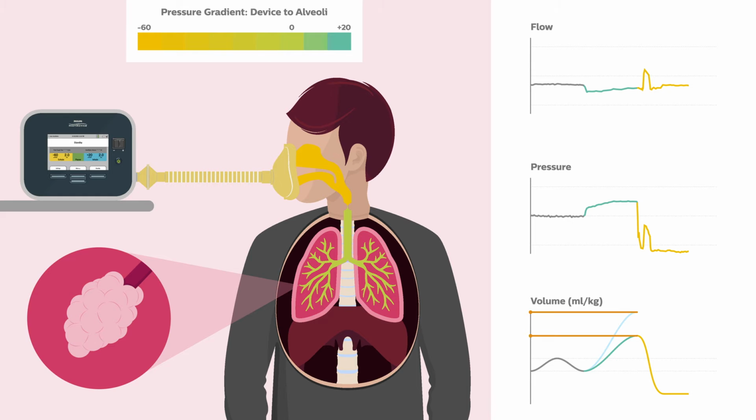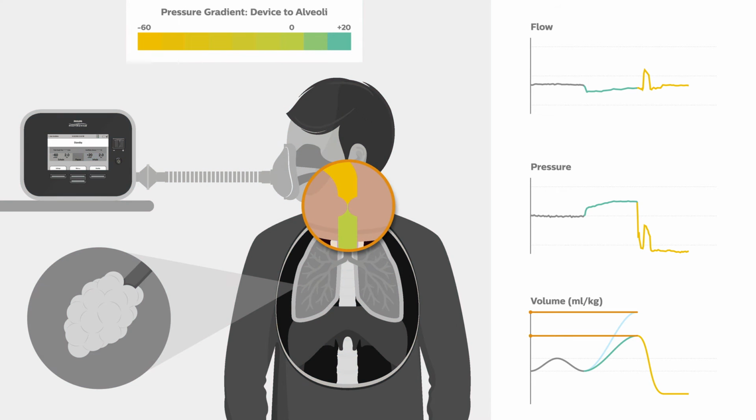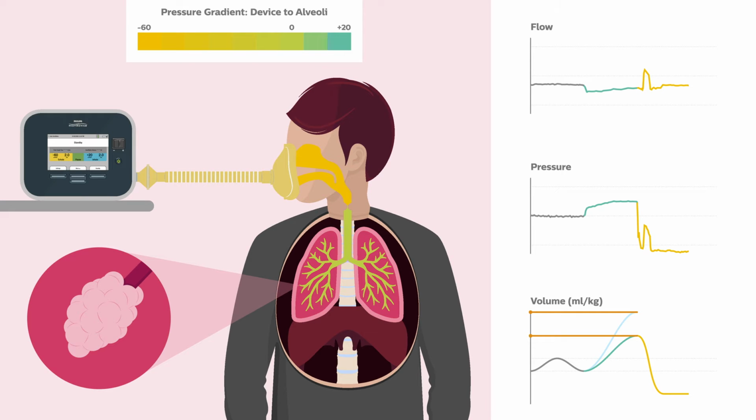In this animation, we did choose to demonstrate complete upper airway collapse as a result of the shift in the zero pressure point. However, the level of upper airway compression and flow limitation ultimately depends on the level of effort during the active cough, the target negative pressure setting, and the pressure gradient that is ultimately achieved. The point is that asymmetrical pressures can shift the zero pressure point and negatively impact the effectiveness of MIE therapy even in a healthy adult.